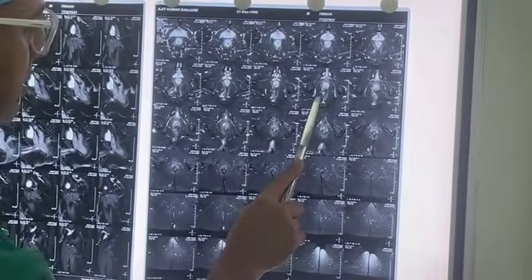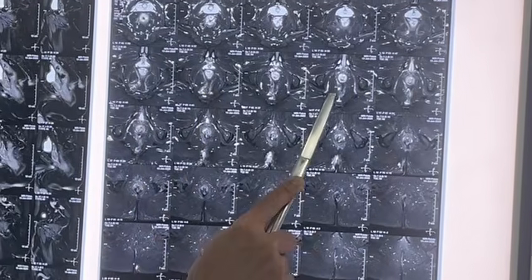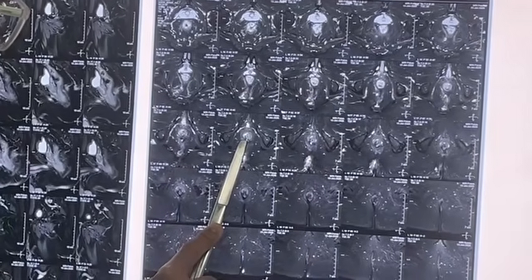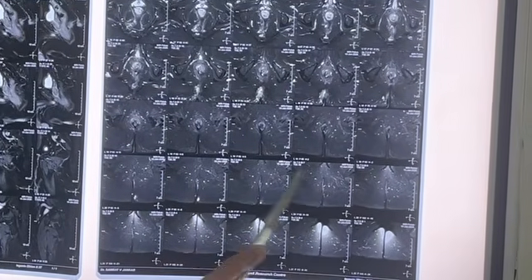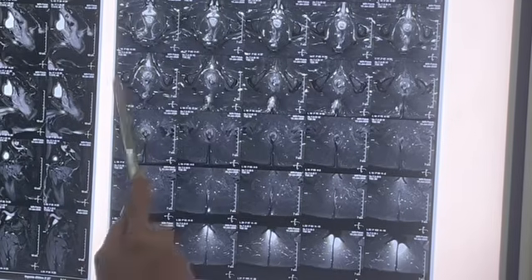There is complete hyperintensity below the coccygeal plane, and things are going up, and in this one area we can see that it is opening at 6 o'clock. So this is from near about the 5 to 10 section of the upper mid or upper part of the anal canal.